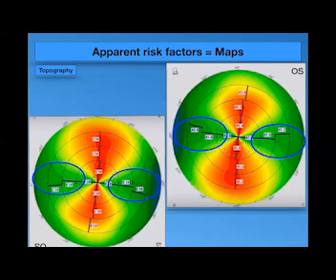Finally, to summarize this slide, look at the topography. If there is a normal, regular, acute bow tie like shown in these figures, you will find in the normal spherical cornea that the superior points are like the inferior points in the central map. But if there is a difference between both, it may be related to conical, not completely smooth surface of the cornea.